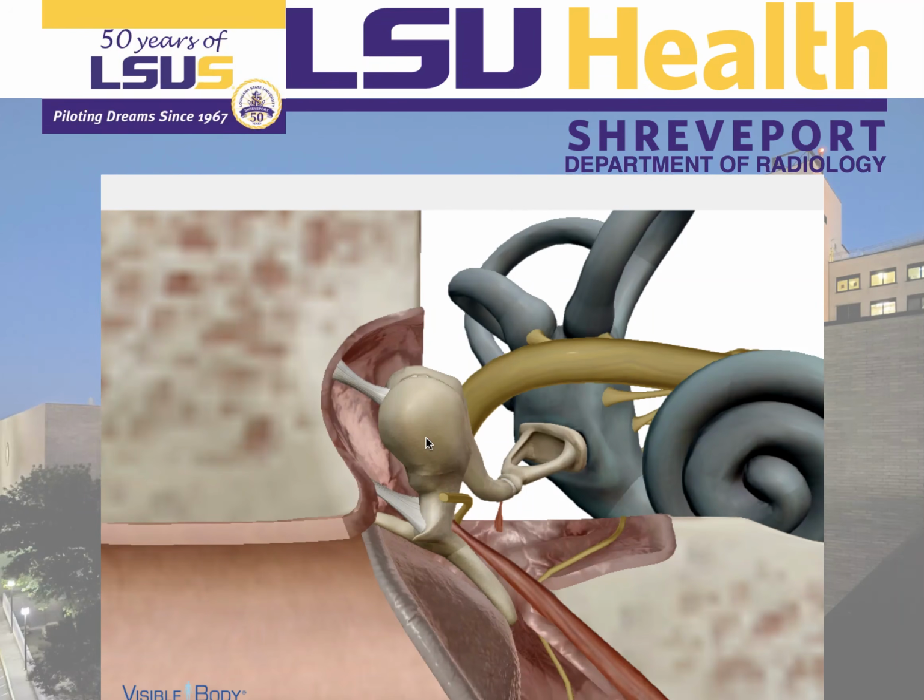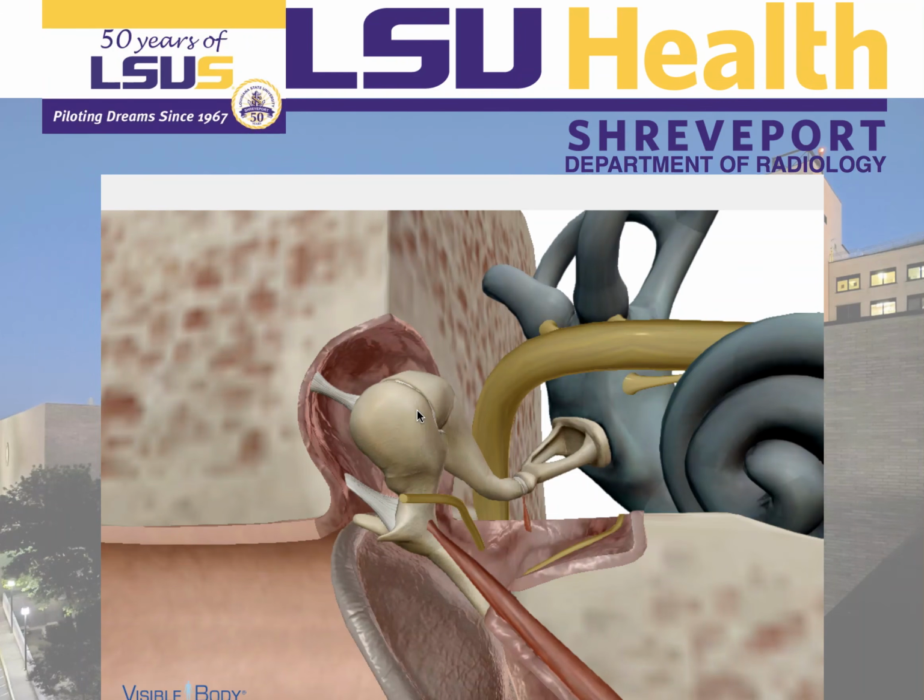Here, a better view of the ossicles, handle of the malleus, neck, head. Remember, guys, that the malleus looks like a hammer and like a femur. So it has its handle, it has its neck, and it has its head. Okay?